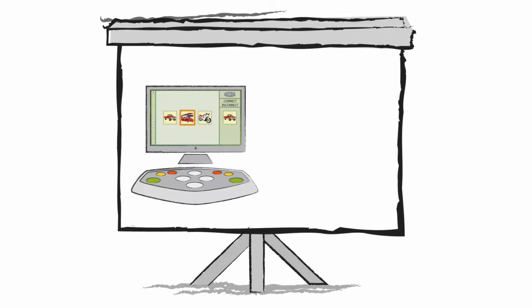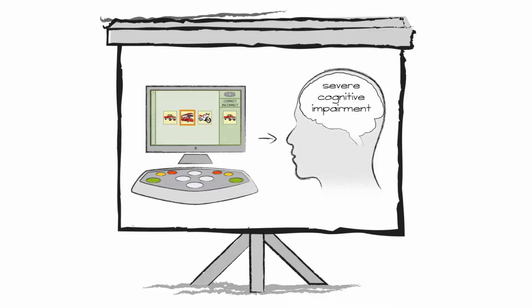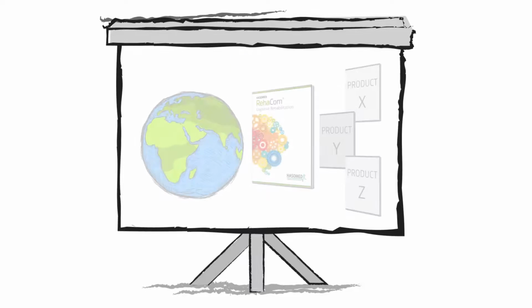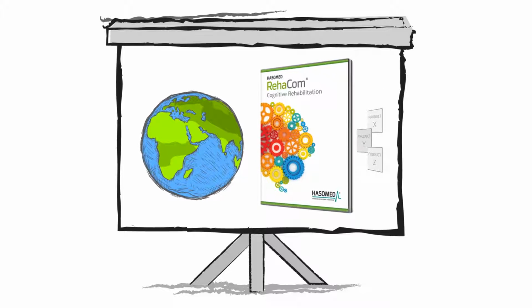This easy task can be solved even by patients with severe cognitive impairments. So most RehaCom modules can be used by these patients in early rehabilitation. No other product on the market offers this solution.